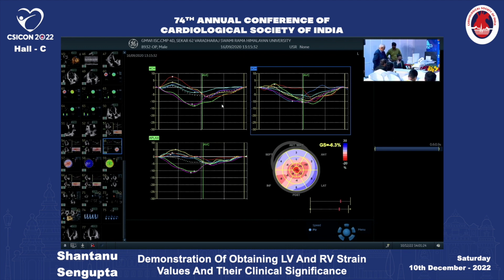Any questions? Please don't draw too much conclusion. Because this is a patient with dilated cardiomyopathy. If you ask me whether this patient has an ischemic dilated cardiomyopathy, whether there is coronary artery disease, it is not possible, nobody can tell from this. Even if you see the post-systolic contraction wave and the ischemia and all that, you cannot say.